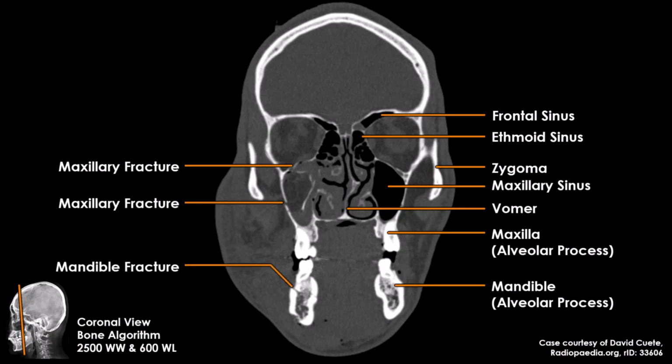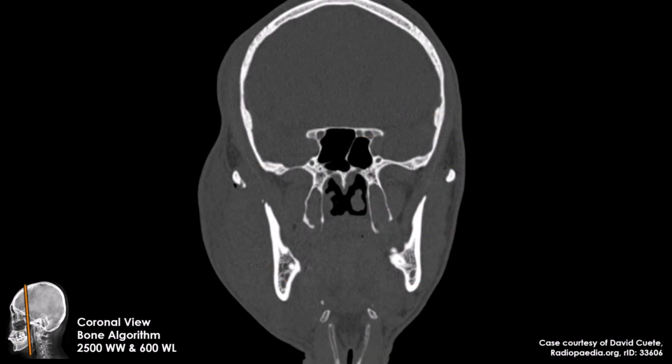and once again, we can see a fracture within the mandible. Moving again deeper into the face, still in the coronal plane, now we can see some very different structures, starting at the top of the image. This is the squamous suture, which is the joint between the parietal bone and the temporal bone. This large cavity is now the sphenoid sinus within the sphenoid bone.